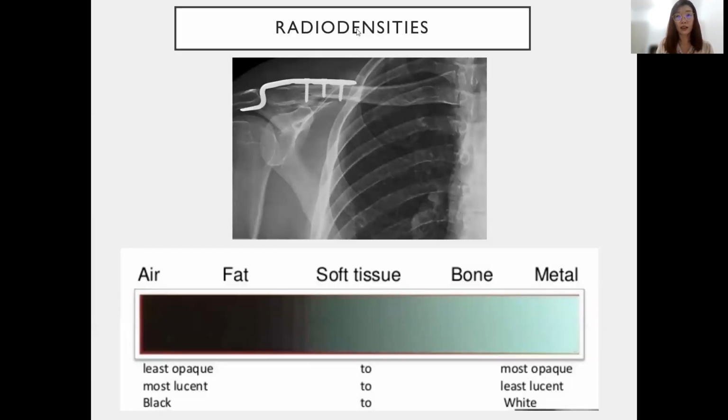So these are the differences in radiographic density that appear differently on X-ray. We start from the air. Air, the X-ray can penetrate through it, so you won't see anything. So it will be black. Especially you can see at the edge of the film, this is very dark, as it is outside the view. Inside here, because the lung field is full of air, with some pulmonary vessels in between, we can see a fairly dark area of lung fields.